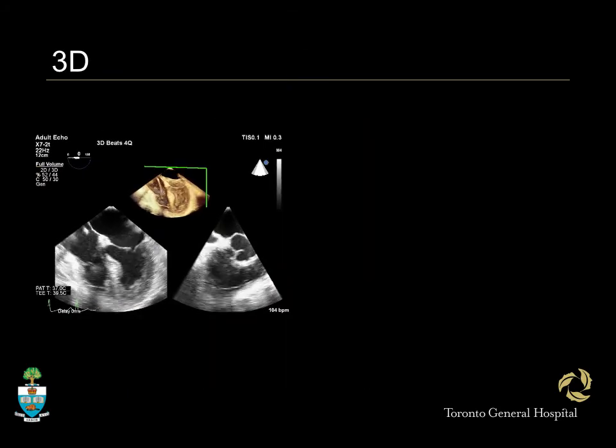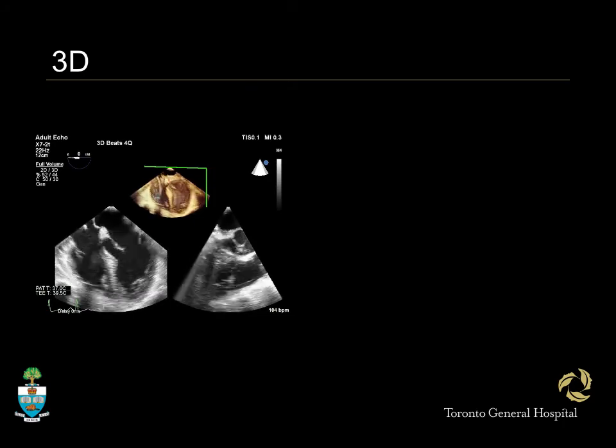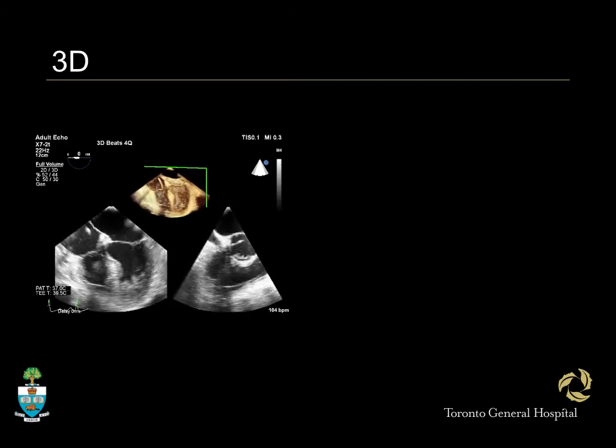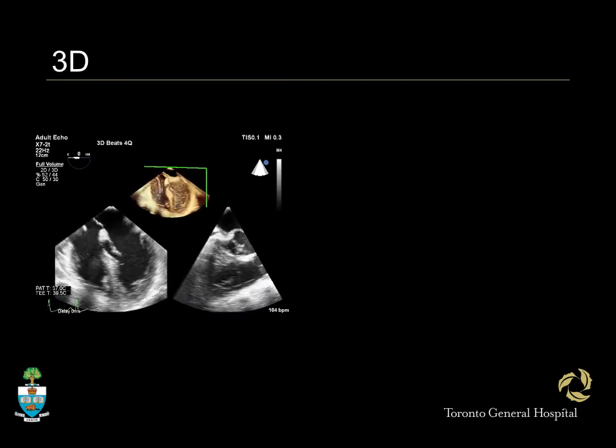So finally, we are looking at the strain in 2 dimensions. I get a slice of the right ventricle, and we look at the strain on this slice. So we're only looking at the movement of these dots along the line on this plane, right?